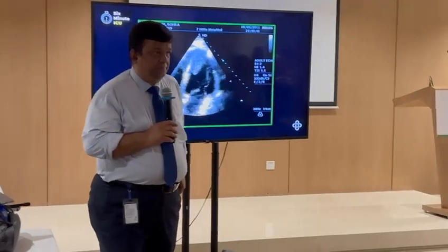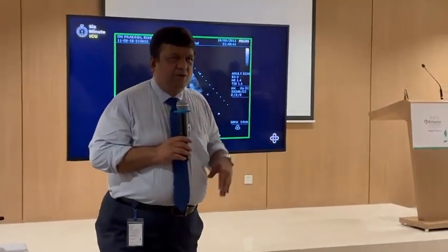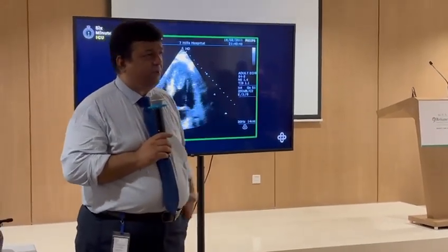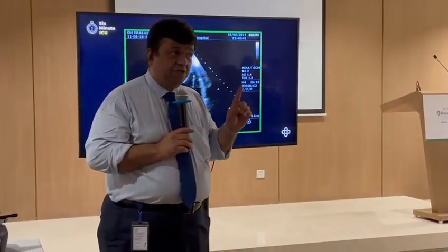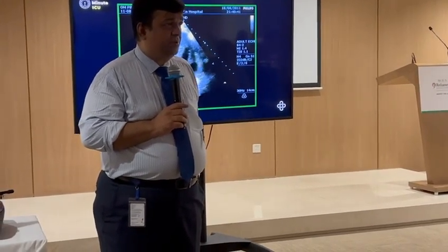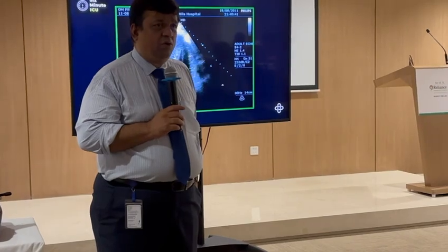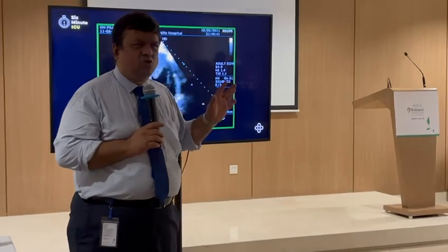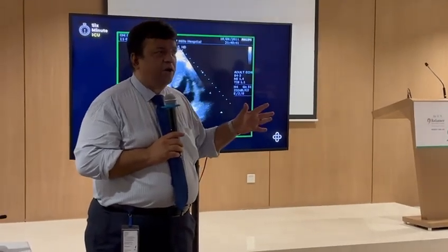Tell me. I've only got videos, not much is written. Think and tell me. So, going back, we are looking at LV function. So, first question should be good, moderate or poor? Good. Good? All of you agree good? At least moderate. Somebody who is not agreeing good, at least moderate. I agree it's good. But whoever doesn't feel so, at least it is moderate.